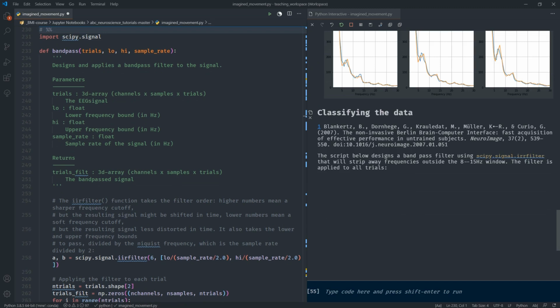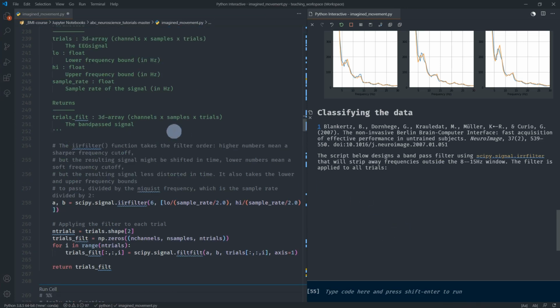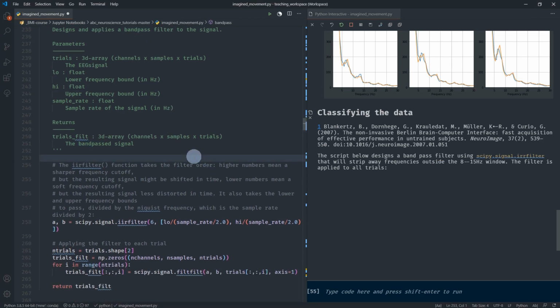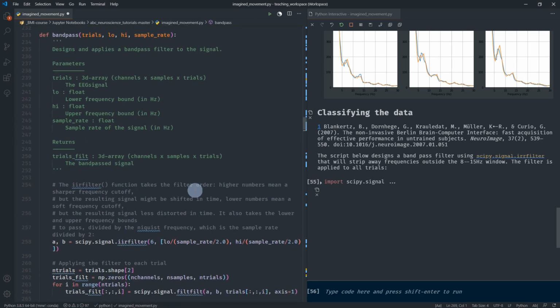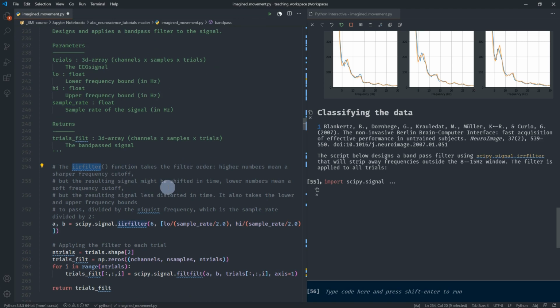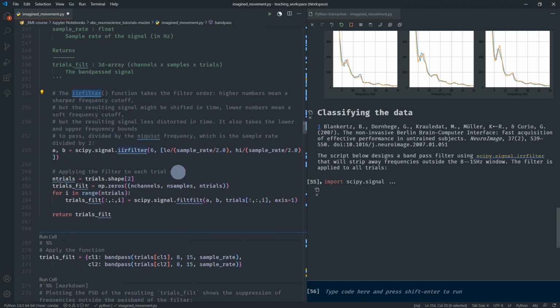We will follow a classic BCI design by Blankertz described in this paper. The authors use the logarithm of the variance of the signal in a certain frequency band as a feature for the classifier, which means taking the logarithm of the variance of the signal in the mu band. So first we need to define our bandpass filter as follows, which allows us to apply a bandpass filter to our signal between the frequency band of interest. It defines the low and high pass parameters. We pass the trials along with the sampling frequency rate, and an IIR (infinite impulse response) filter is applied.